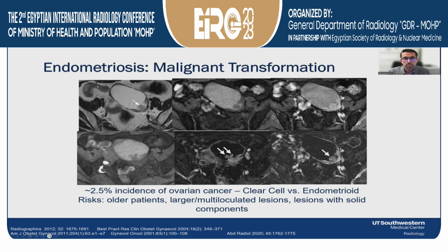So let's look here. This is from the literature. A large cystic lesion that's predominantly high signal intensity on T2, but there is this more nodular area of low signal intensity on T2. And if we look on the pre-contrast T1, the majority of the lesion is bright. However, there are these nodular areas along the wall that are dark on pre-contrast T1, and then they disappear on this post-contrast image, and the subtraction image confirms enhancement. So this is solid tissue within the endometrioma. Should really be worried here about malignancy within the endometrioma.